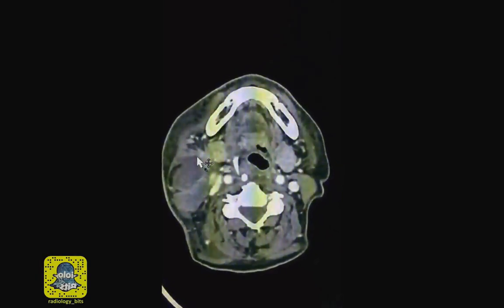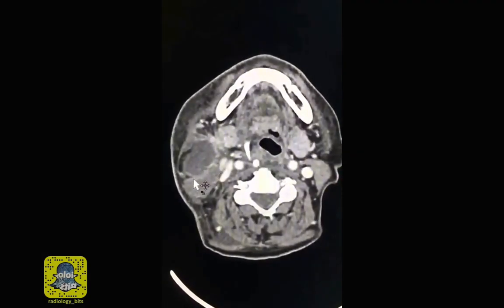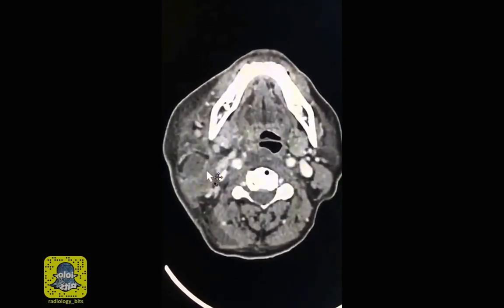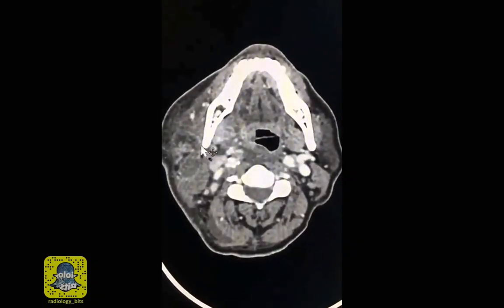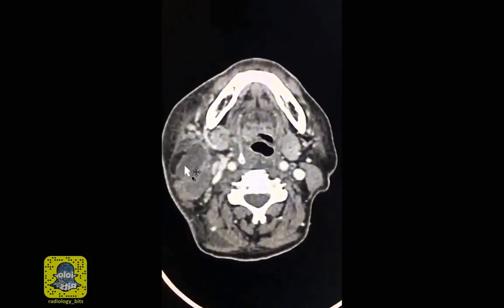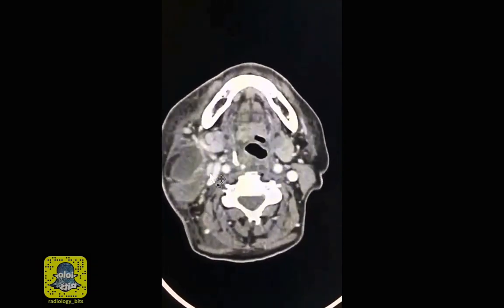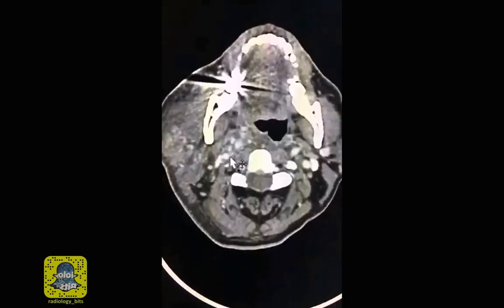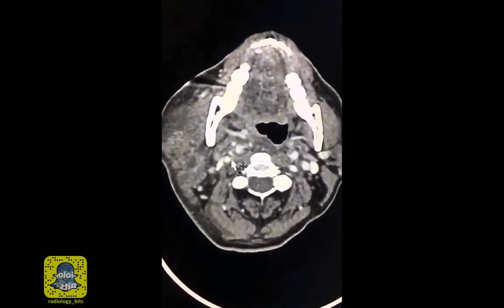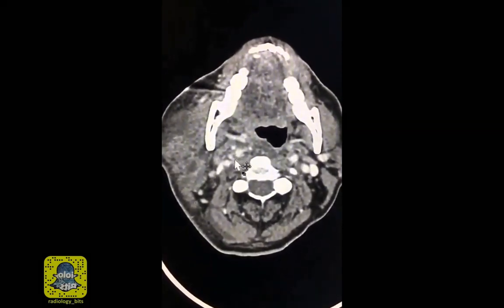be the second type. The second branchial cleft anomaly lies on top of the sternocleidomastoid with a cystic component that's most commonly seen at the mandibular angle level. It could be a pure cyst, or it could have a sinus or fistulous component with the tract leading all the way to the tonsillar fossa, classically running in between the internal and external carotids. And that's why this space here is stranded.